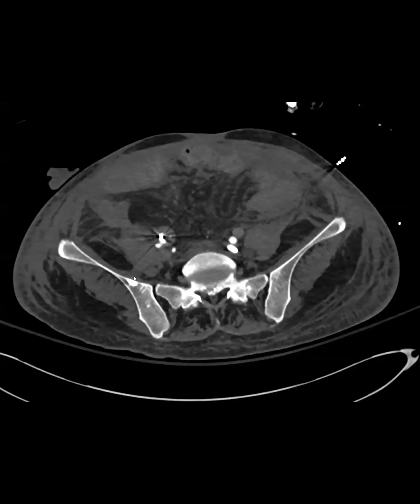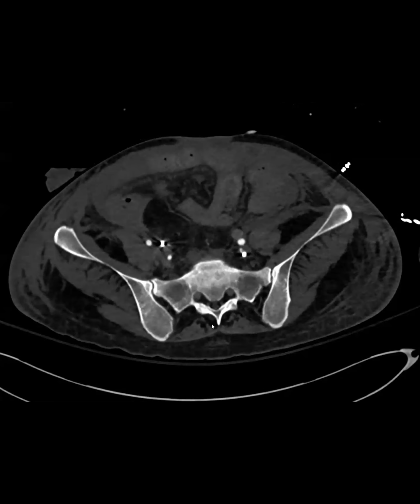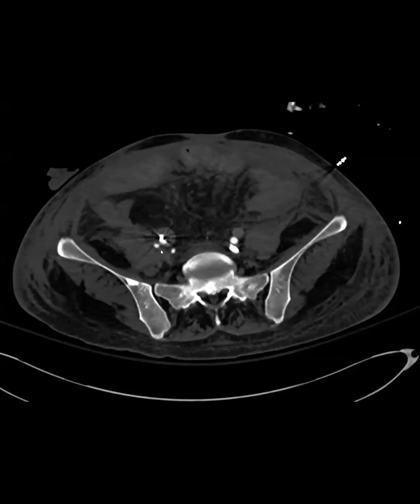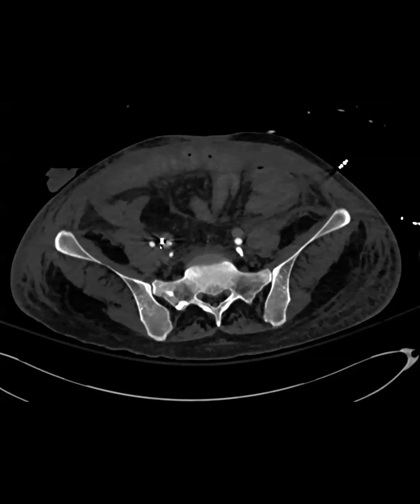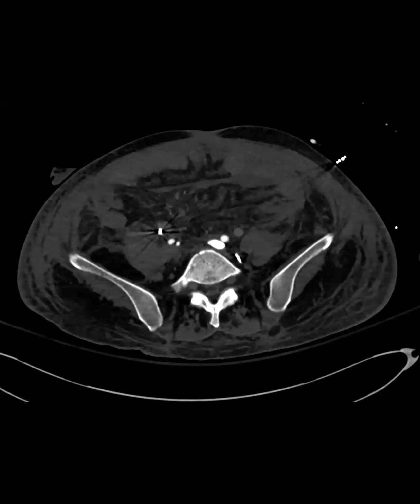Usually those patients will have intermittent hematuria, where little bleeds go into the ureter. Then at one point, because of something or a stent exchange, it opens the floodgates and they have massive hematuria. This is a CT angiogram example of the artery extravasating into the ureter. You can see the dilated ureter; the hydro was also because of fibrosis at that crossing area. Then I'm going to show you the angiogram as well.